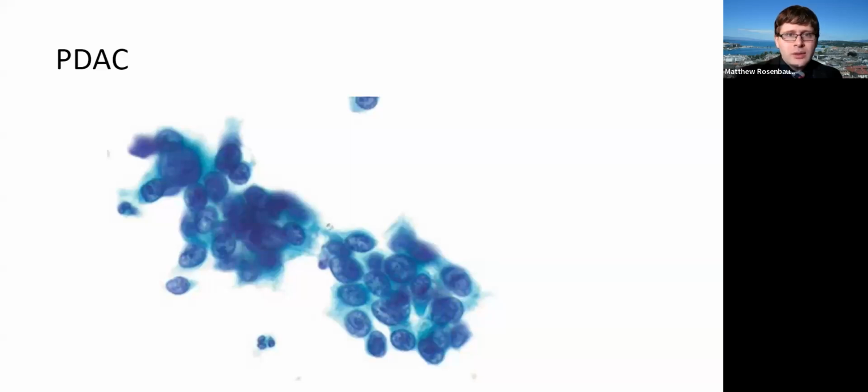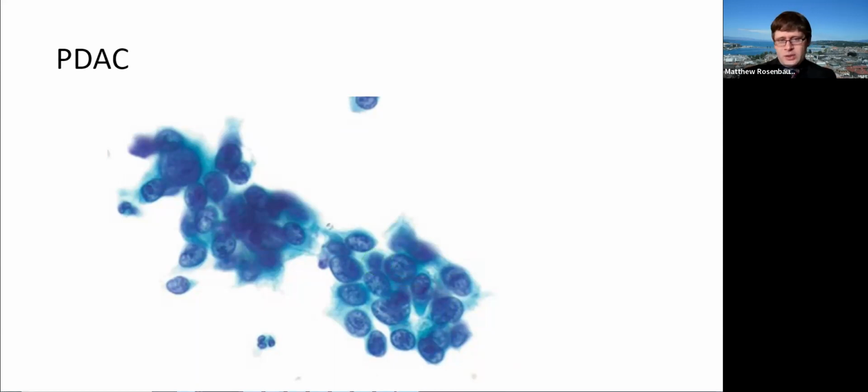I can annotate very quickly. So let's get some circles. You could argue that maybe this one here, of course, you want to make sure you're not counting lymphocytes, is quite a bit smaller than this one here. It's not the best 4:1 rule I've ever seen, but the point is these are very obvious malignant looking adenocarcinoma cells here. So when you get a pancreatic mass like this, these ones are comparatively straightforward. However, there are some histologies that are very, very difficult, like the next set of slides, which shows, sorry.